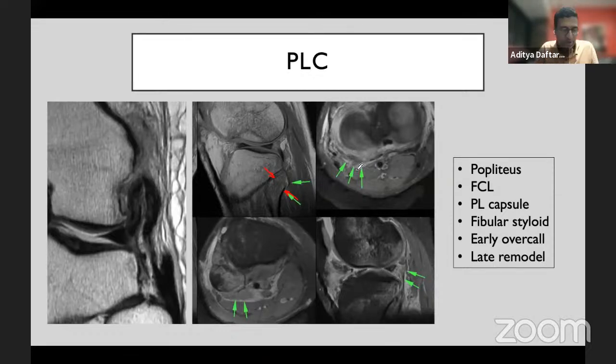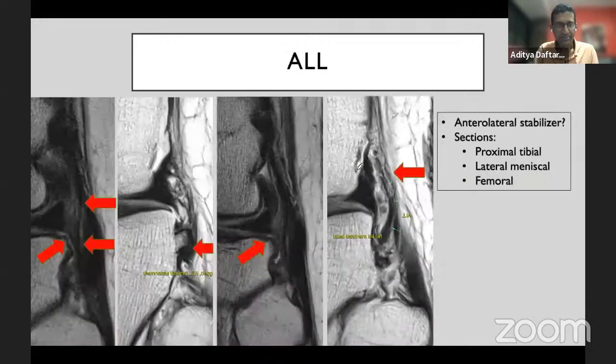The problem with posterolateral corner injuries is unless there's bony avulsion, oftentimes these injuries remodel well. So again, if you start to look at these patients 2, 3, and 4 months out of the injury, it's often normal for us to see these structures looking intact, but actually the patient does present with laxity.